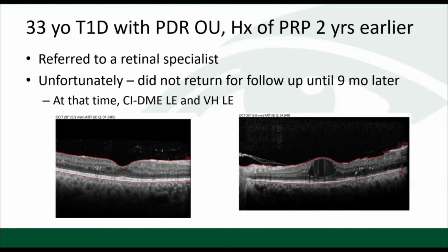You already alluded to sometimes you might not have access to fluorescein angiography. You might be in a practice that doesn't have it, or you might be in a satellite that doesn't have it. And to establish the level of the disease and the need for treatment, OCT-A can be very helpful. I think also these patients a lot of times have other comorbidities. It's hard to get access.